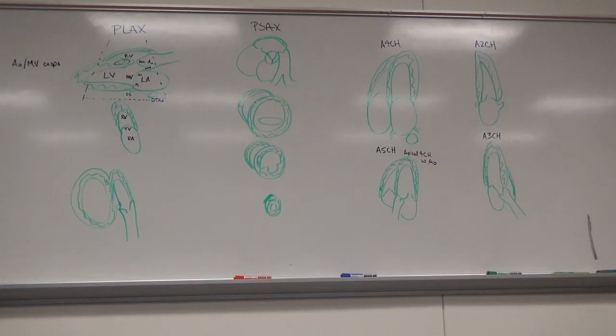Tricuspid valve is the biggest valve, area-wise, and, you know, it gets leaky. It's also the lowest pressure chamber of the 2 chambers relatively, and so they get a lot of leakiness and stuff because it's so big and floppy and low pressure. And we'll deal with that when we get to some pathological stuff.